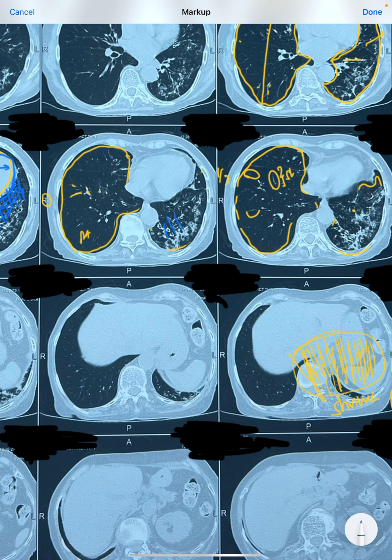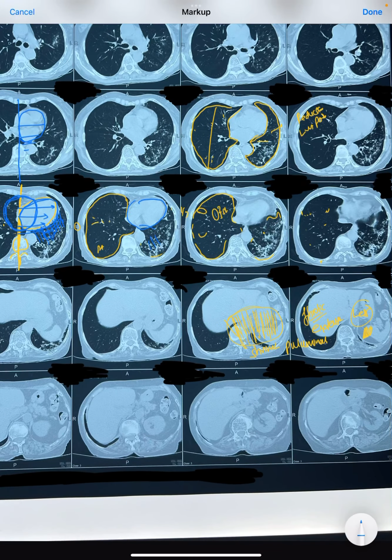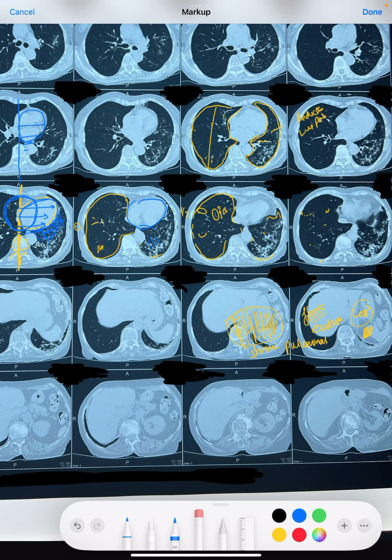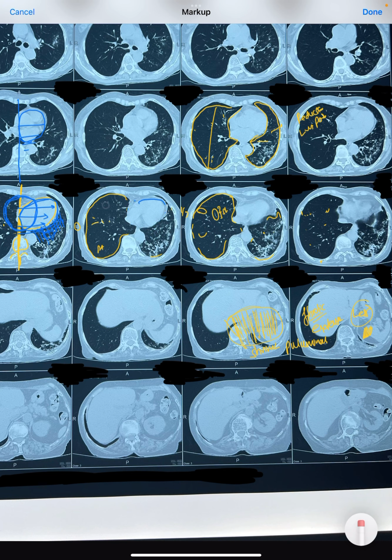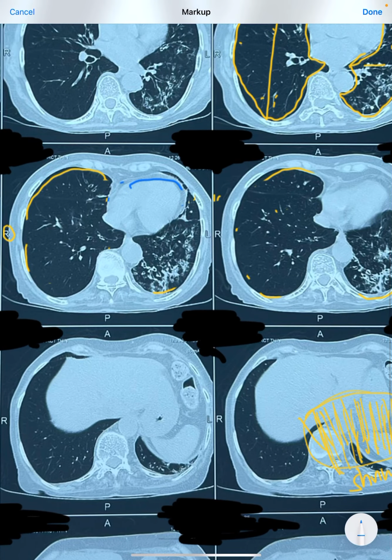This lung has completely pulled all the mediastinum toward this side. So this is a very interesting HRCT chest which shows significant fibrotic bands because of the large lung parenchymal lesion which was there in the past, which did not resolve but caused significant fibrosis.